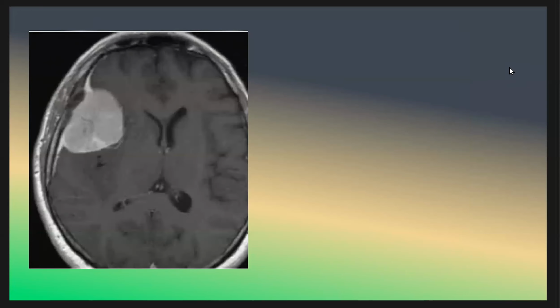Here you can take some moments, about 10 to 20 seconds, and see what do you think about this case.